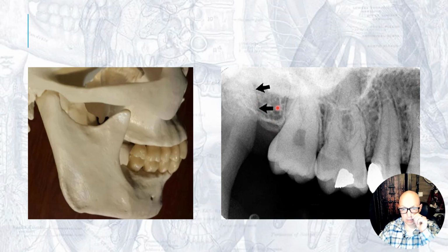I always tell the example of someone I know who was a dentist who saw something back here that looked like a root tip. Do you see how this looks like it could be a root tip? Obviously, we see more of it here, so you wouldn't mistake that for a root tip. But he had planned to go in there and extract that root tip that was left in there. Unfortunately, he took another periapical radiograph, and there was nothing there. And what he determined is it was this structure.